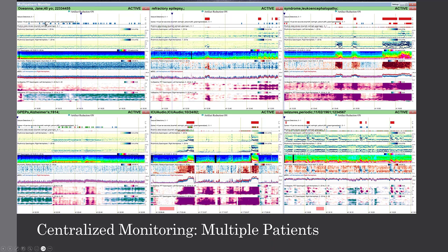Now, this is one where we have very slowly evolving changes in the upper left. Again, not everything we're looking for is a seizure. And what these versus baseline trends show us is something that we don't see in the uppermost trends. We see a pretty stable pattern here in all the trends. Not a lot changing from left to right.